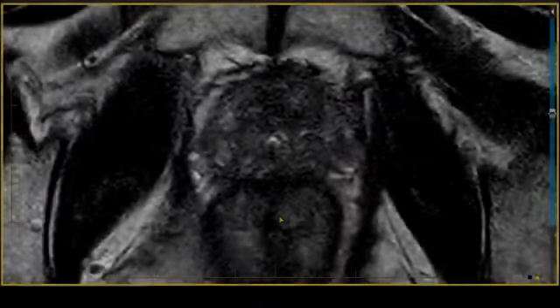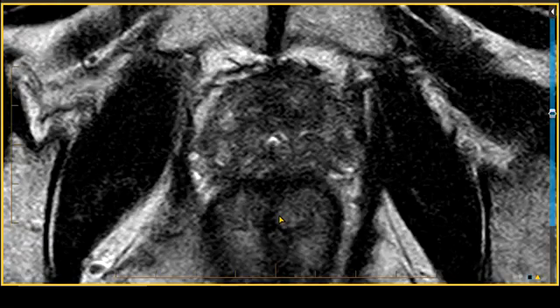This next multiparametric MRI case of the prostate shows the value of multiparametric MRI to be added to the patient who is in active surveillance for low-volume, low-risk prostate cancers such as Gleason 3+3 prostate cancer. This patient is a 70-year-old male who was diagnosed with low-risk, low-volume Gleason score 3+3 prostate cancer, also called grade group 1, with transrectal ultrasound-guided biopsy.